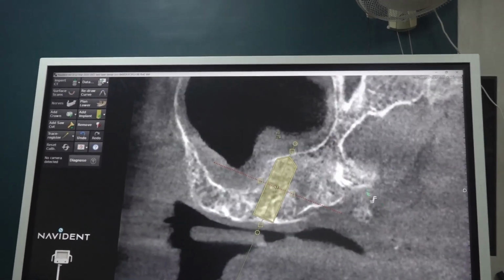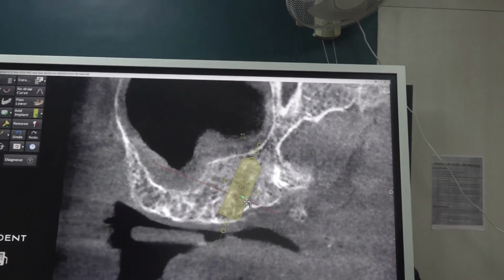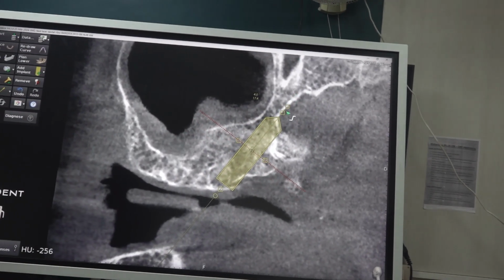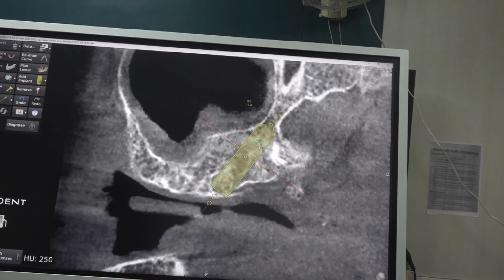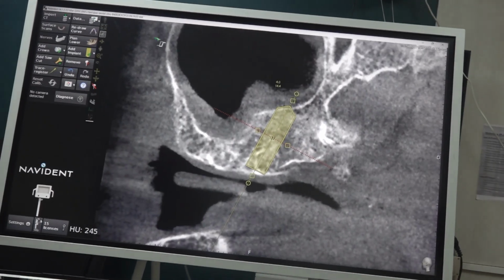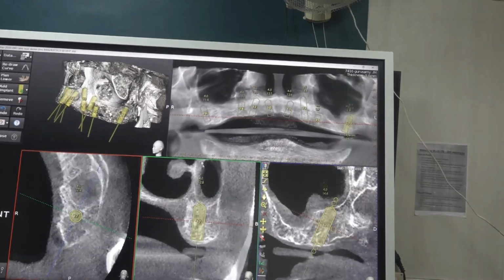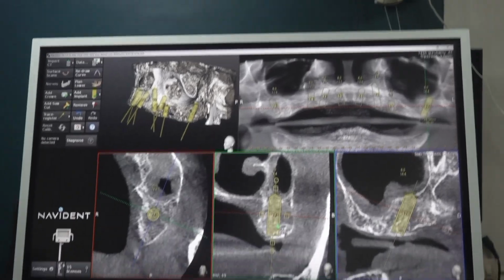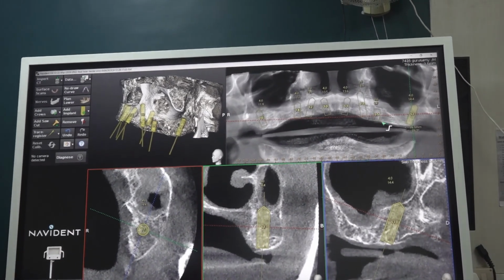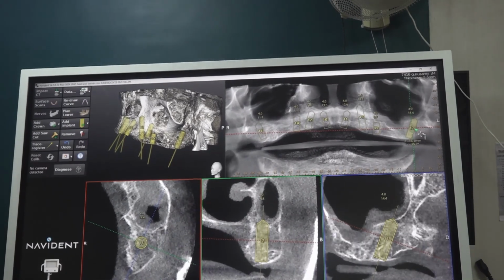See, if you want to catch pterygoid, we have to go more distally and angulate it. Otherwise, we can start drilling anteriorly, make it more vertical, not a short implant, not longer as pterygoid. You can place a 13 mm very comfortably. So for designing milling, it will be a much more comfortable option.